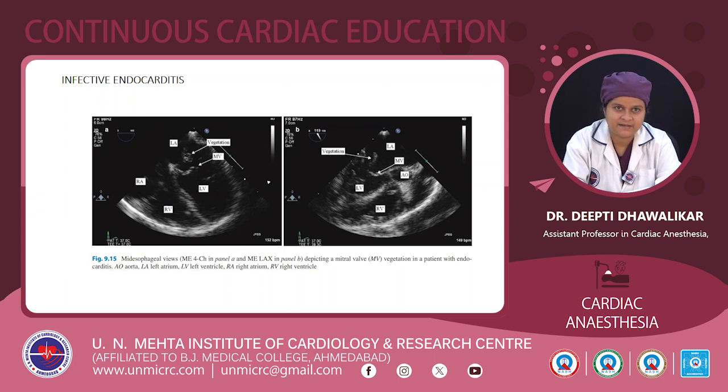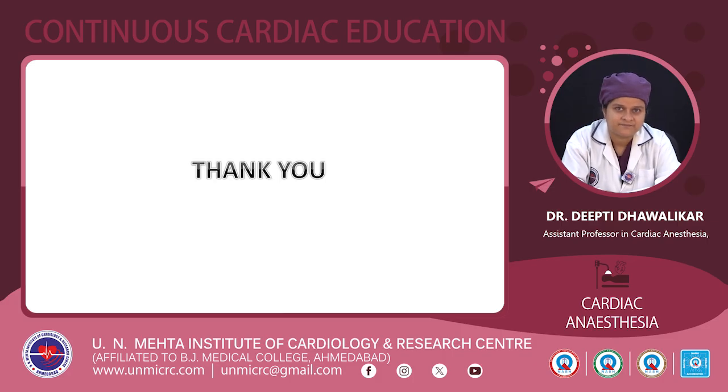Last is infective endocarditis. TEE is also very important for diagnosing infective endocarditis. The vegetation is seen as an echogenic structure which is attached to the mitral valve in the figure.